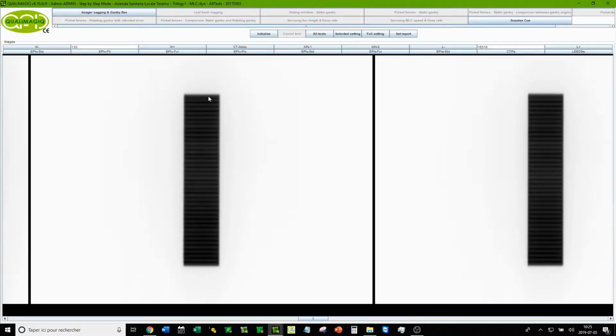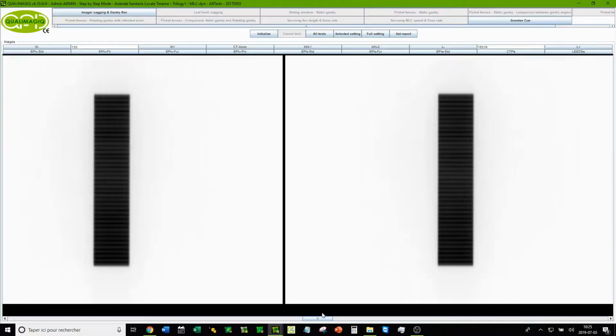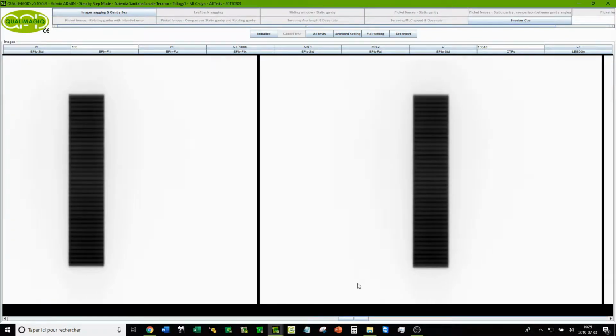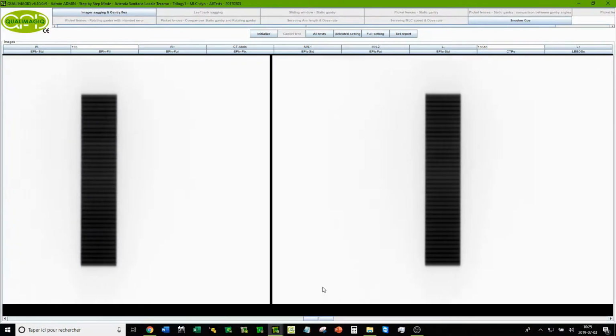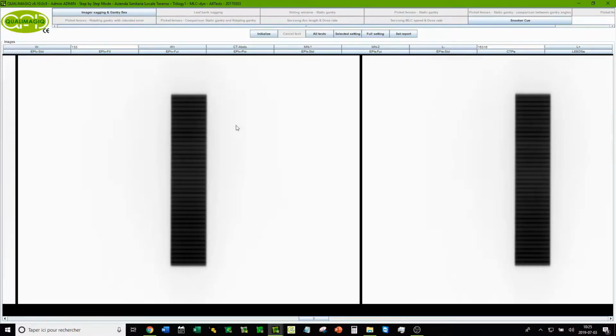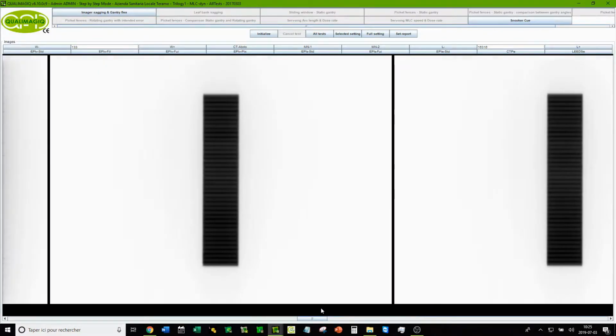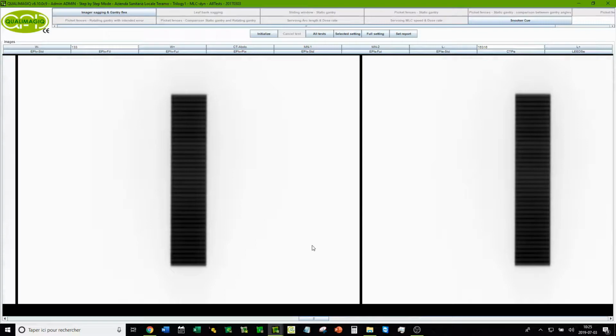You are aware that at 90 degrees, the MLC needs to go up, and at 270 degrees the MLC must go down, given that it is much easier for the MLC to go down than to go up. If the MLC speeds up as it goes down, the dose will decrease with the increased speed of the MLC, and you have prescribed the same dose for each radiation field. This test will consist in verifying that the LINAC correctly controls the MLC speed and is not impacted by gravity.